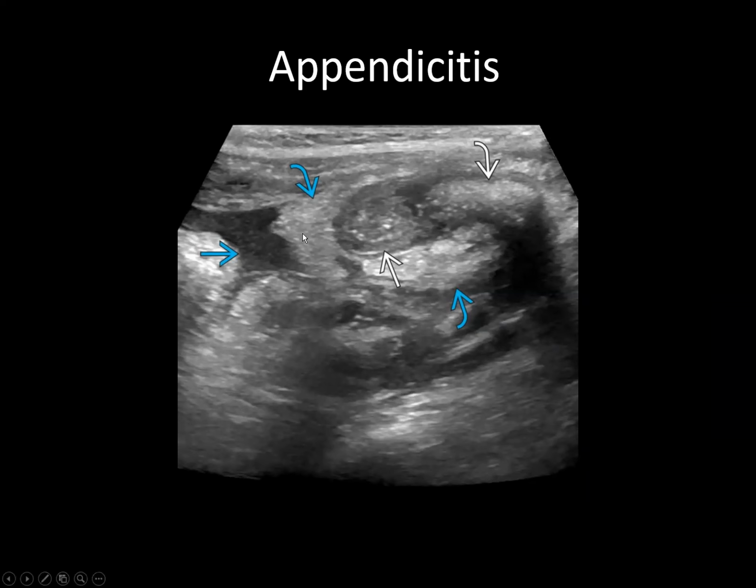If you have an abscess, that's pretty much a slam dunk on any modality that it is perforated, but free fluid is kind of plus minus. You can suggest it, but it's not 100% specific. Suspicious though, but they can clinically examine to tell if there is indeed perforation.